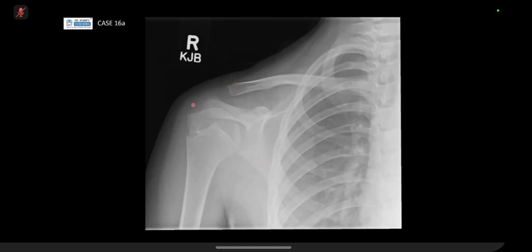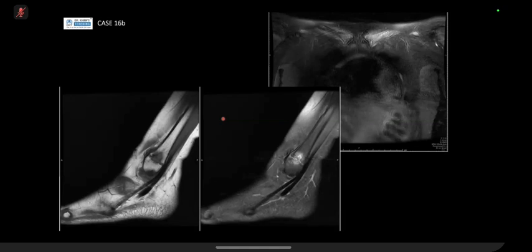Okay, but then MRI will help you clarify it. Just remember your acromion ossification, actually I don't think it starts to form until you're about your 20s, or late teens. That's why you never see the acromion. Right.